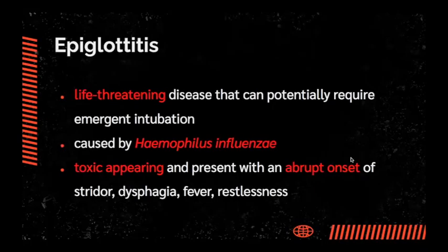So epiglottitis is another condition which is life-threatening. It is caused by Haemophilus influenzae, and the patient will present very toxic-appearing with abrupt onset of stridor, dysphagia, and fever. All right, so this is another case, probably a slightly older kid with acute stridor.